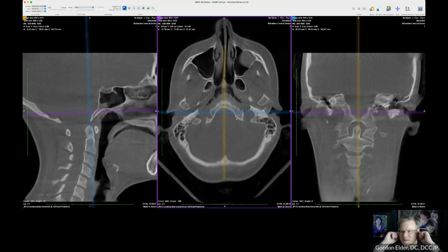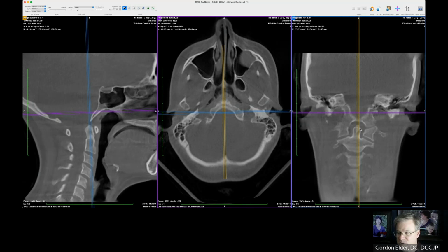The ear canals are not the same on both sides of the skull. A little forward, a little backward, a little high, a little low. People aren't made symmetrically. So when we start getting into millimeters and tenths of millimeters, it's not super accurate to know exactly what's going on. But when we were walking up to the patient, the next two planes aren't quite as critical. So I'm going to go ahead, and I can see them because they're the ear holes.